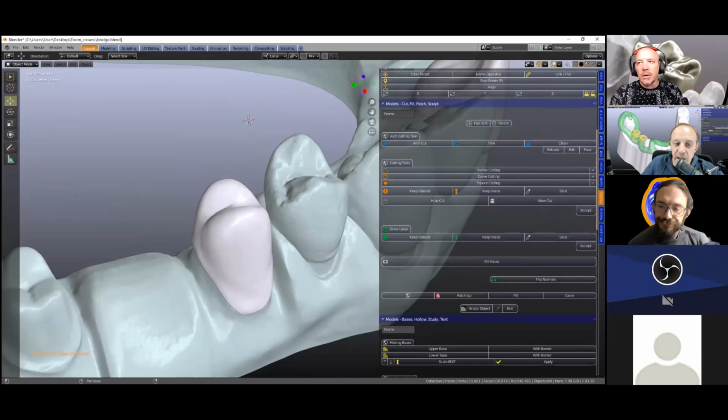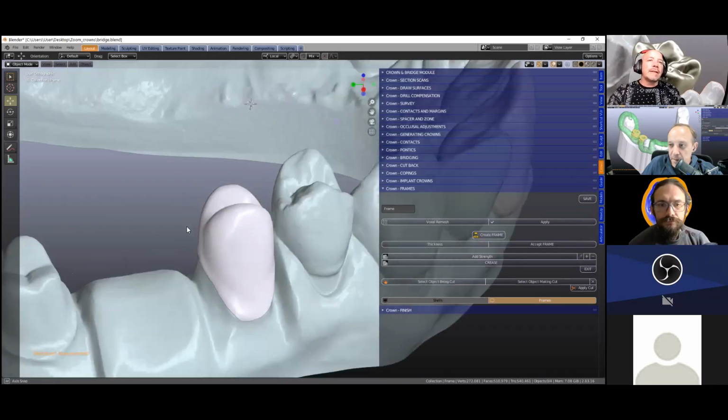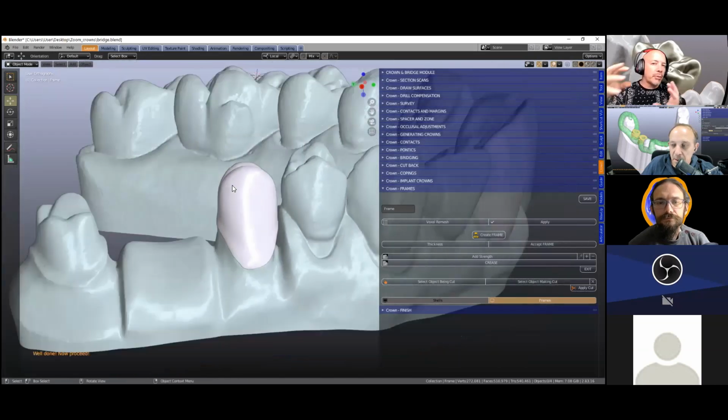And then the other crown question: we had an inquiry from a big German company to do a zirconia bridge frame, but then have an Emax pressing bridge cemented over the bridge frame. Look, Wolfgang, that's another thing we would have to think about, because you need to worry about undercuts. If you've got a bridge on top of a bridge already, we need to make sure everything fits. I think all the tools are here ready for this, but it would be like a playlist of how to get to the end result.